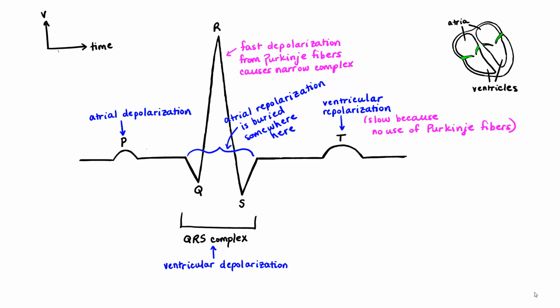And since there are so many variations in how a tracing can look, it's very, very important to go over and really understand the terminology that we use to describe a tracing. So I'm going to give you the same diagram again, and what I'm going to do is reiterate some concepts that we went over before, but there will be some additions that will be key to understanding how variations in the tracings work.